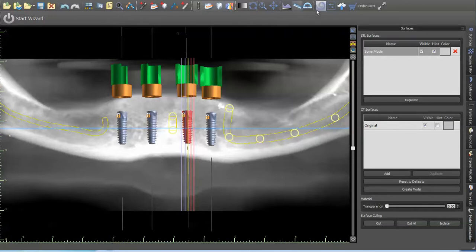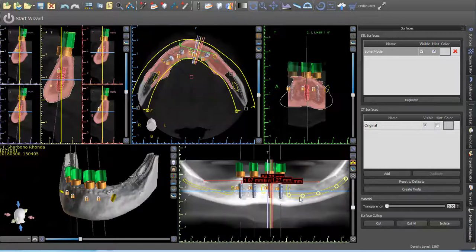So what you can kind of see here is when I try to level out the jaw with the posterior segments, that's pretty much as deep as I was willing to go with these areas. So what we want to do is just horizontal plane this out, and then from this area up, that's about 1.5 millimeters subcrestal, 1.6, 1.7, 1.2. So 1 to 1.5 millimeters subcrestal. You can obviously change these dimensions when you actually do the implant placement.